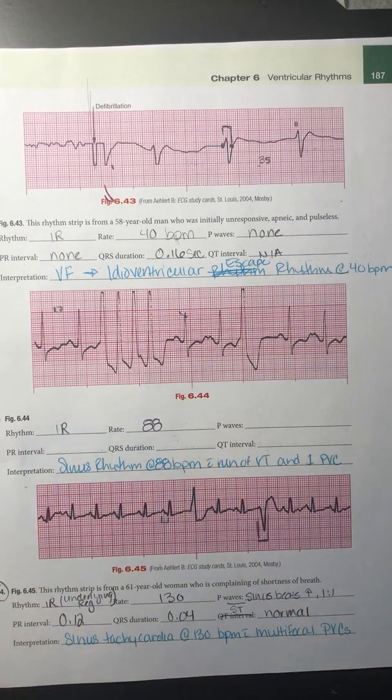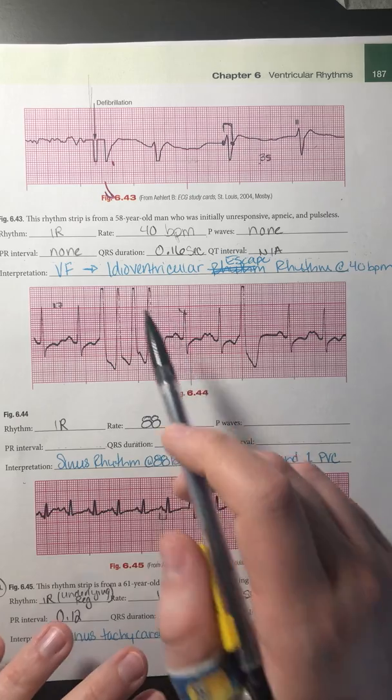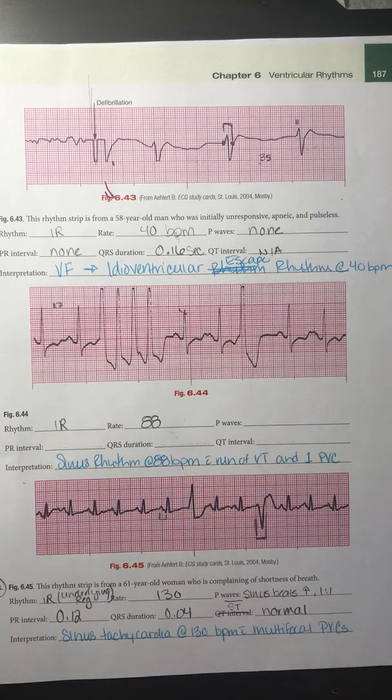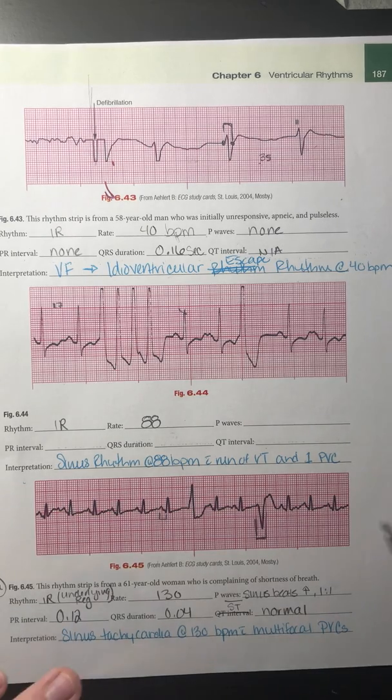And when we first come out of a ventricular fibrillation, it's usually very irregular. Sometimes it may not even represent an actual rhythm. You just kind of get these bizarre looking complexes. And the idioventricular escape or ventricular escape rhythm is really common to see after a shock.